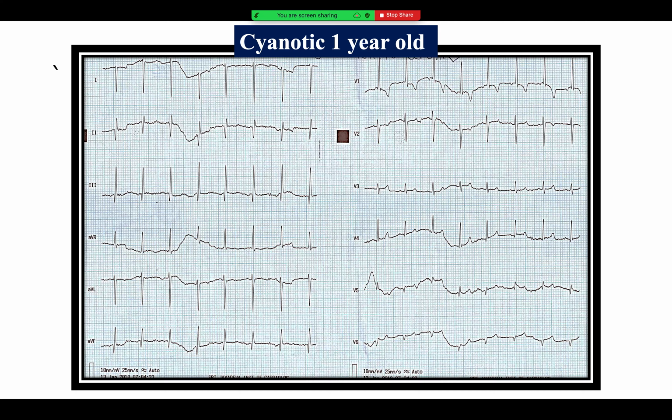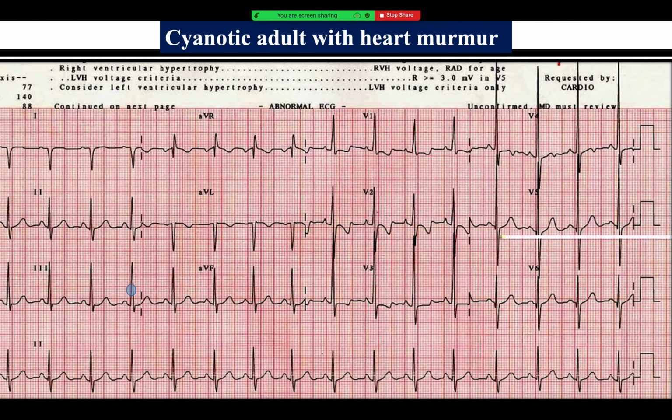Since I'm super nice, I'll give you one more ECG now, and some hint as well for you. What is happening? So, what do we notice? We notice, see, even there's something written over here as well. You can take some inspiration from that.